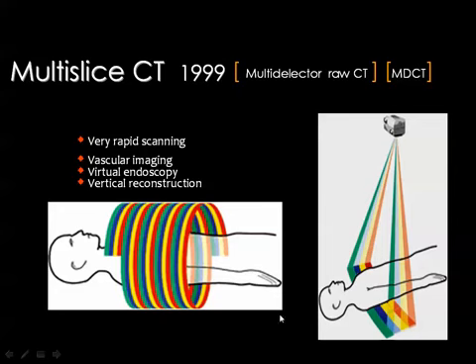Then you have the images, and you reconstruct as you like, as I will show you. Then also virtual endoscopy: you can go through any tube in the human body using this virtual endoscope built into the CT scan.